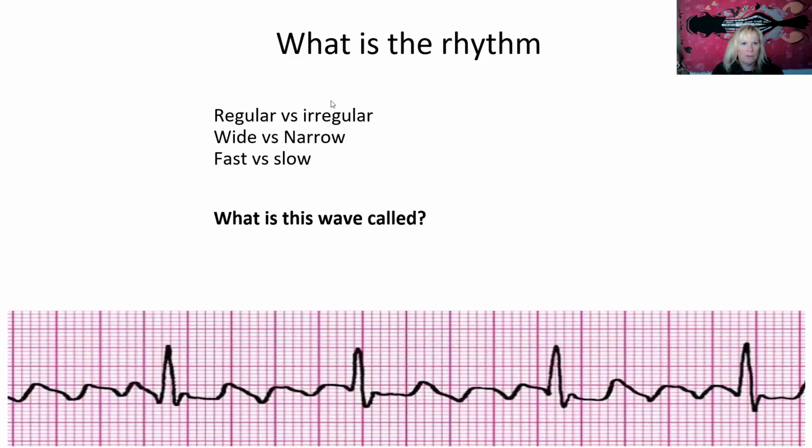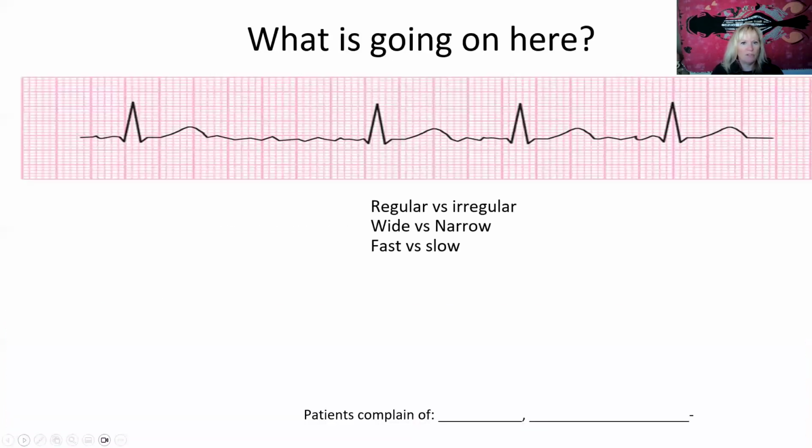So the question I would have for you about this is, can flutter actually, oh, shark teeth. I like that you said that, TC. Can flutter cause stroke? Is it possible? Yeah, absolutely. A lot of people don't know that. So you do have to be careful. You do have to do a CHADS-VASc score on someone with atrial flutter. And if it's elevated, they potentially need anticoagulation to prevent stroke.